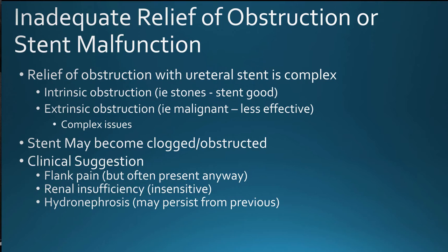Radiologists are often involved with evaluation of whether these stents have become obstructed or are not functioning well, and this can be difficult clinically, because the symptoms of stent obstruction and malfunction overlap those of a typical stent, including flank pain. But we are asked not infrequently to evaluate these patients to assure that there is stent patency and function.